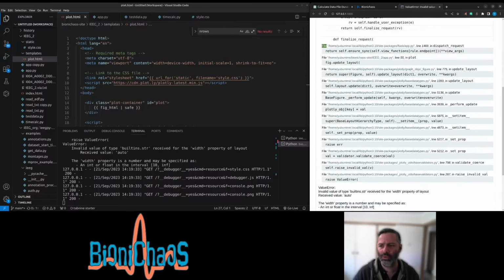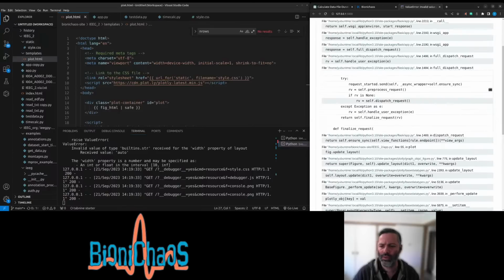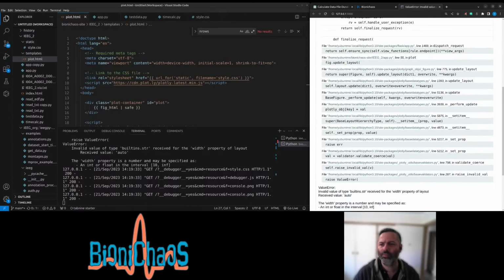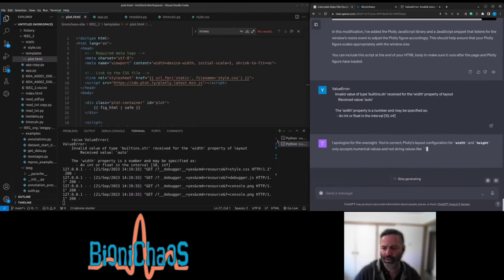Oops. Oh, come on. If it can quickly fix this error.